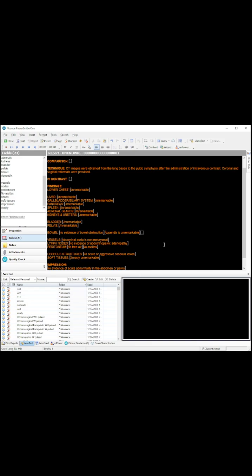Okay, so pick lists are incredibly powerful, and if you don't already use them extensively, I would recommend that you look into building them, or find templates that already have them and clone them, and just leverage this as a reporting tool.